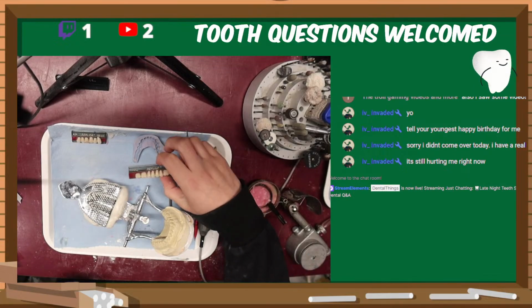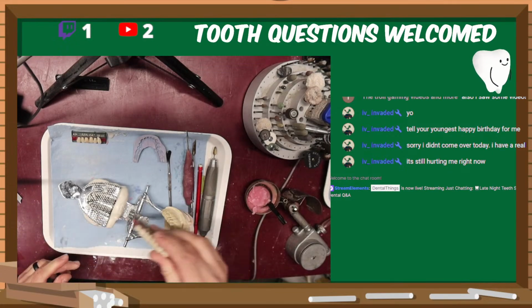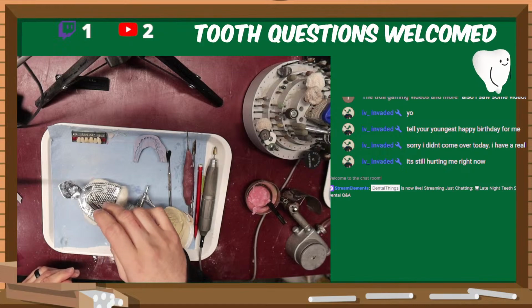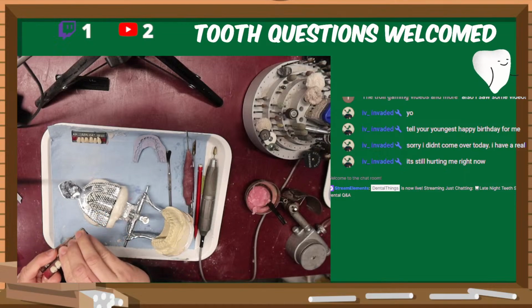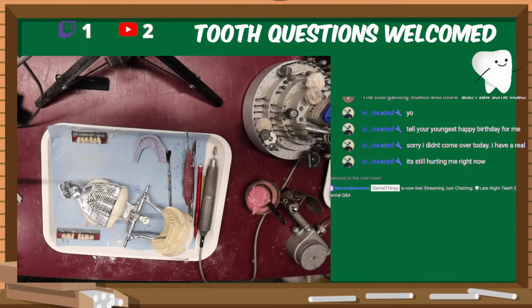In the meantime, I know a lot of these are gonna need some trimming. So I need to do the whole right side and a couple on the left, or 3 on the left, so I can pre-prep those. It's a 2x2.